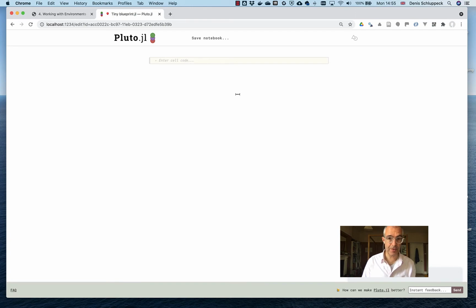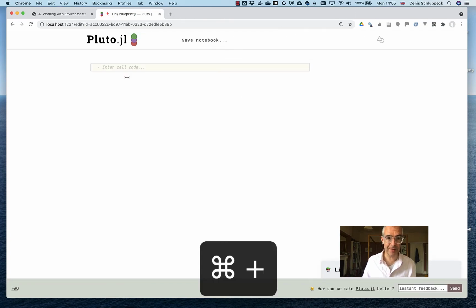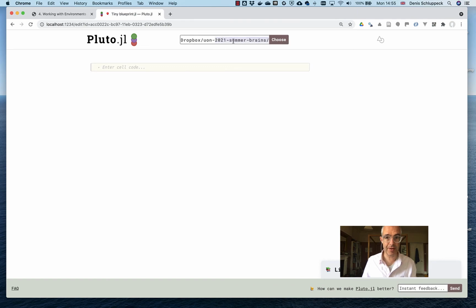So the first thing I'm going to do is make the font a little bit bigger so you can see what's going on. And I will save it. And so I'm in my folder, but I have to give it a name. So I'm going to call it maybe brain-notebook.jl to let it know that it's a Julia Notebook. Okay, and so that should be saved and it keeps track of it. And now I can interact with this notebook.